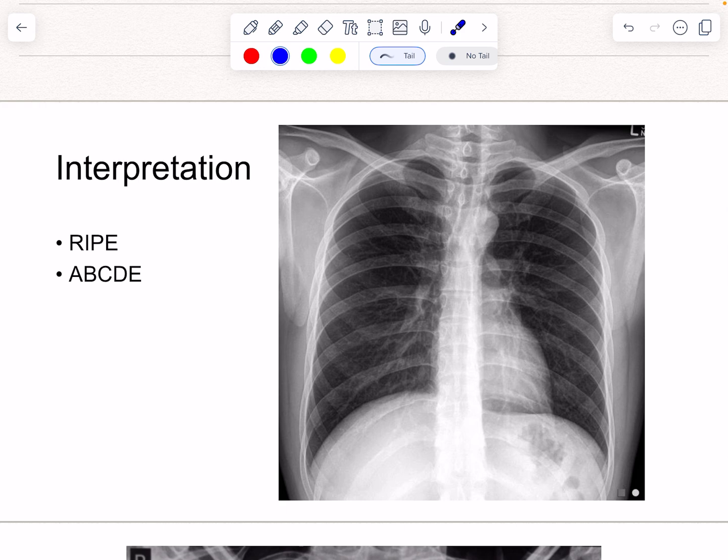approach for. Starting off with checking the airway, I can see that the trachea is central and the carina is visible, and I can see the right and the left bronchi, and there is no obstruction. There is normal hilum size, and there's no enlargement.